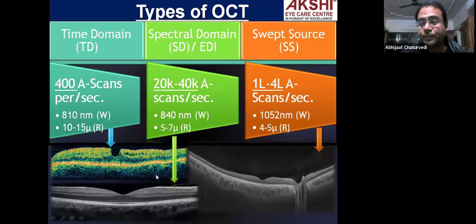colored ones. The grayscale images are always preferable. I've seen in many institutes, people are still following these colored images. So you can miss very minuscule pathologies in a colored image, which is hard to miss on these grayscale images.